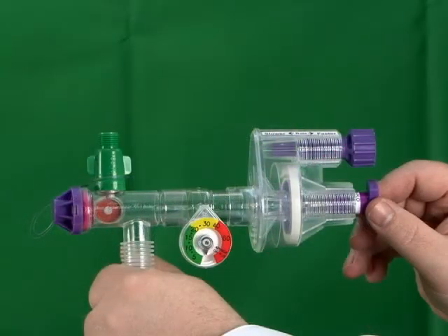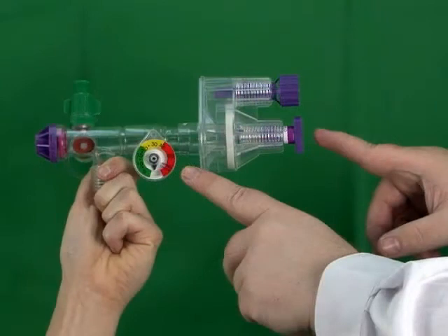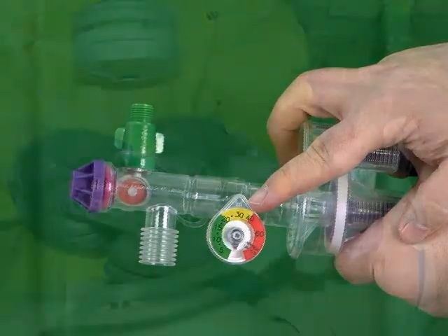Once your flow and pressure have been set, perform a function check on the unit before connecting it to the patient. This is accomplished by occluding the patient connection port and verifying that the modulator opens and the pressure does not exceed 60 centimeters. It is recommended that the automatic resuscitator be used with a pressure manometer. You may use the manometer provided or a manometer of your choice. The PIP indications on the pressure dial label are approximations only.